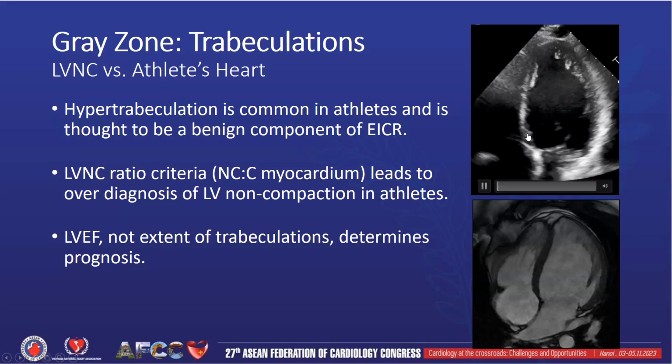This is an individual, both the echocardiogram and the cardiac MRI here, showing some excess trabeculations. And in this case, the ejection fraction was 40% by echo and 48% by cardiac MRI. But there was no LGE and above normal exercise capacity. It's possible that this is simply exercise-induced athlete's heart, but we remain open to the possibility that there may be more to that.